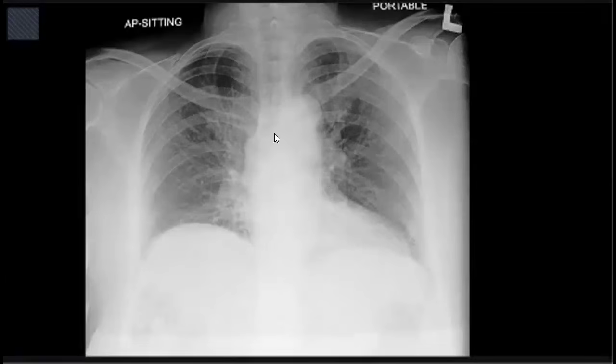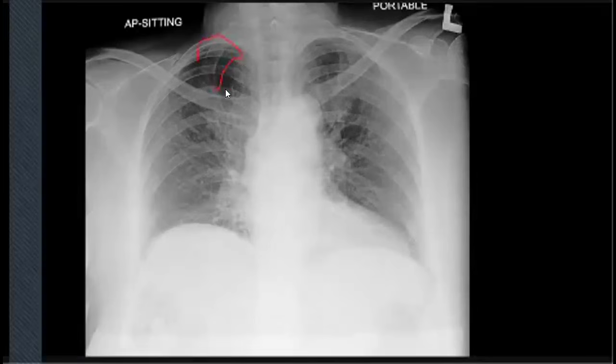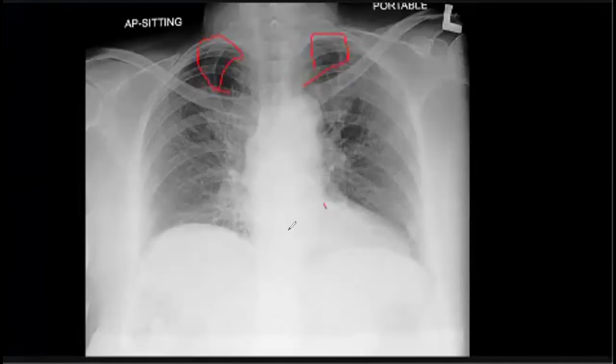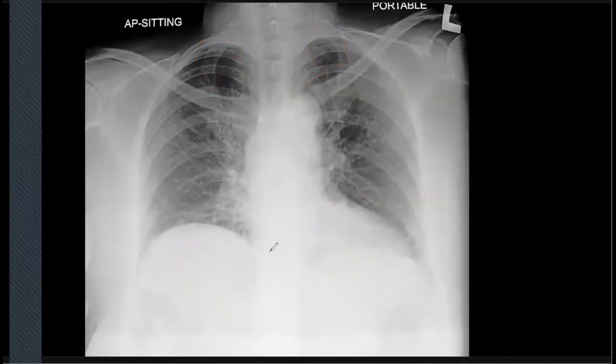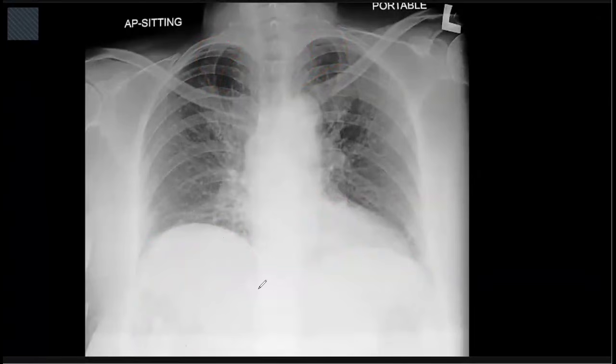You have to look at the soft tissue, and the most important thing, we have to look at the lung apices, retrocardiac region, and diaphragm above and below. If you go here, you can see this subtle abnormality. Maybe this is Chilaiditi syndrome, or maybe a collection with gaseous content. So I have to correlate with the patient history, whether the patient has any constitutional symptoms or something like this.